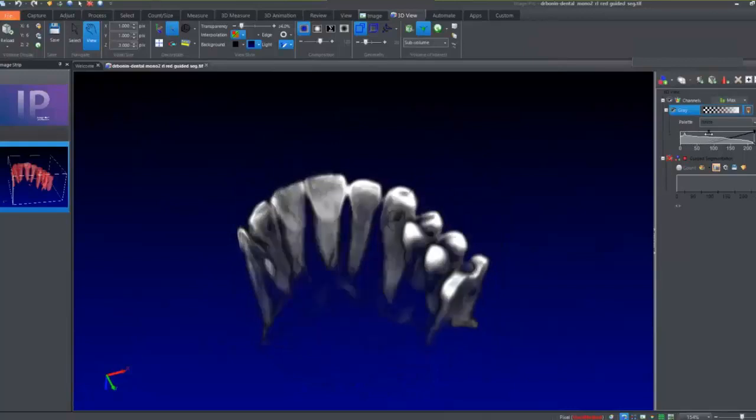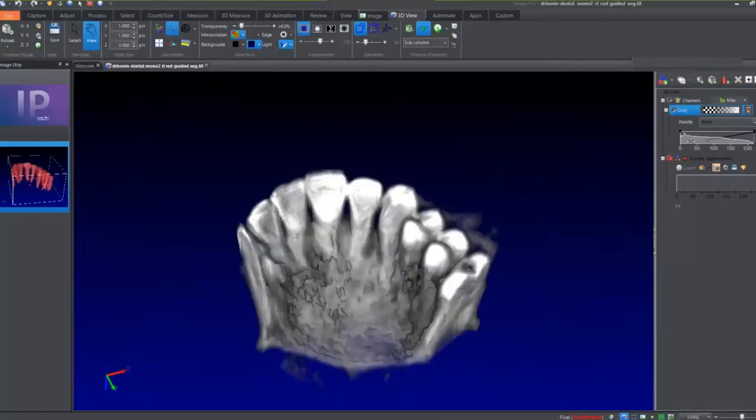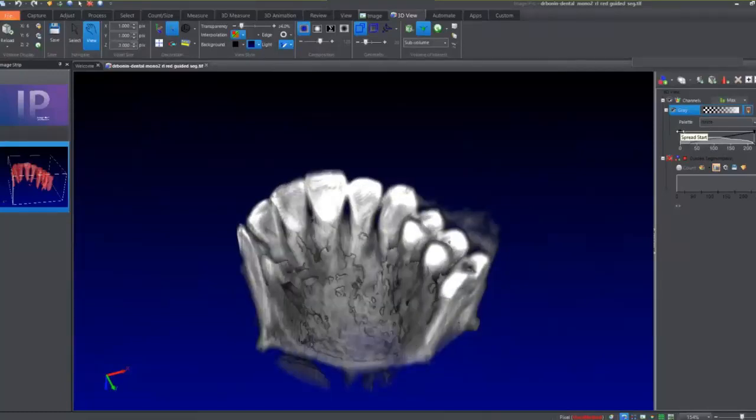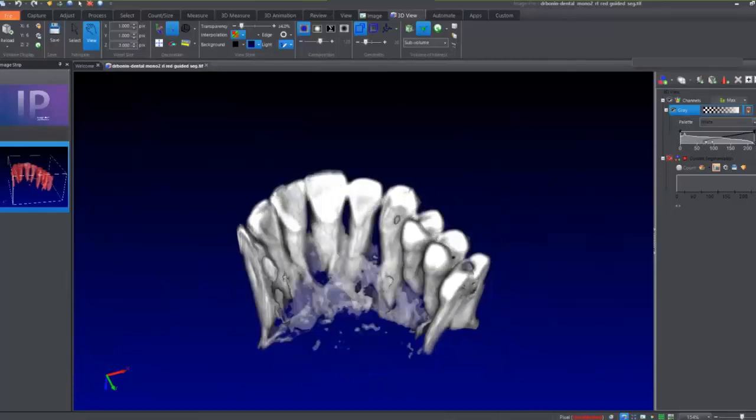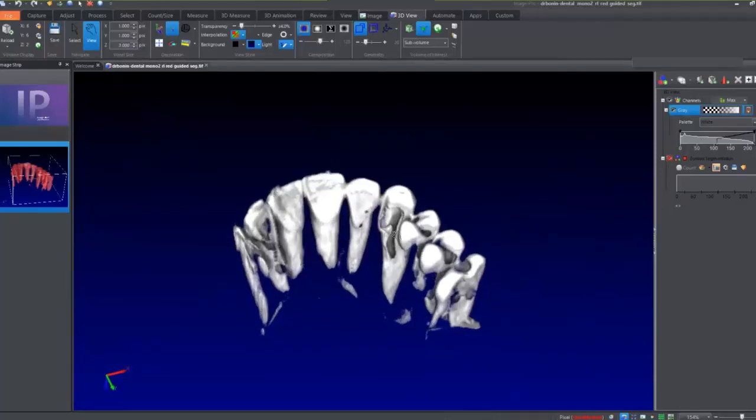These are the lookup table enhancements that can be applied to your data, and these have been enhanced a lot. You basically have full-scale spread on the minimum side and the maximum side, and then you have the opaque setting, which basically allows you to set kind of a threshold below which information will not be displayed. So those are actually really nice, the way that those have been engineered now.